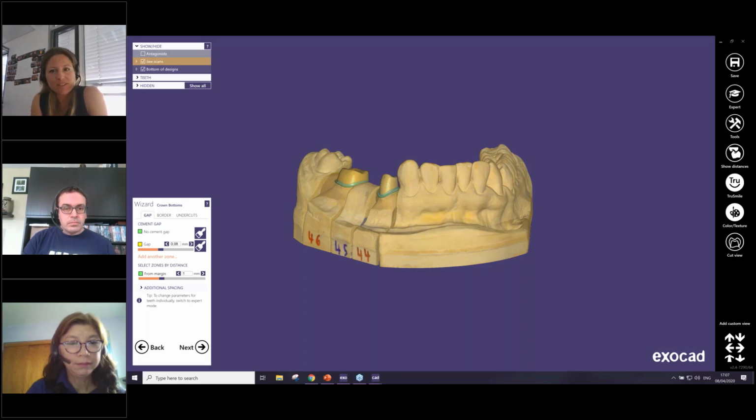It's still fine because it's close to 9, but it's shown in red. That's the only thing. It's not a problem. But if you see it's red, it's better to check if it's really less than the minimum I like to have, or only a little bit, and then I can continue.